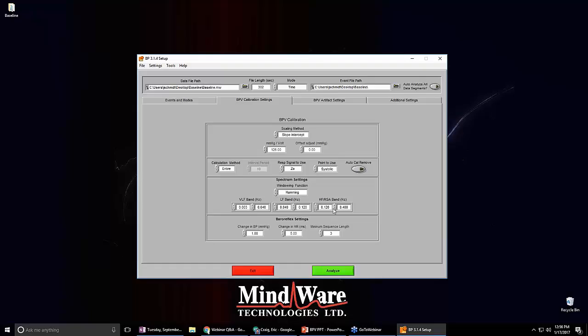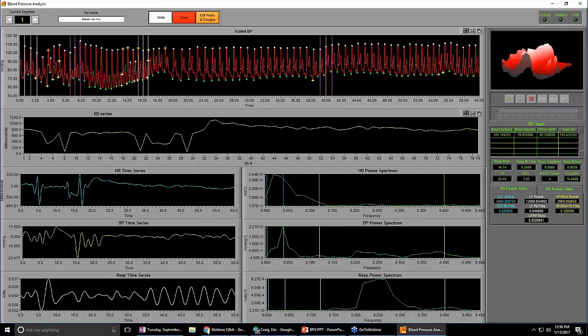And so we can see here, let's just take the high frequency, for example. We have 0.12 to 0.4 in hertz. And then if we look back down here again under our high frequency, which is yellow, you can't see the other yellow here because it's being taken up by the white, but it will go right up to about 0.4. So that's where those bands are actually being adjusted and set. If you did want to change those, please feel free to on the previous screen.